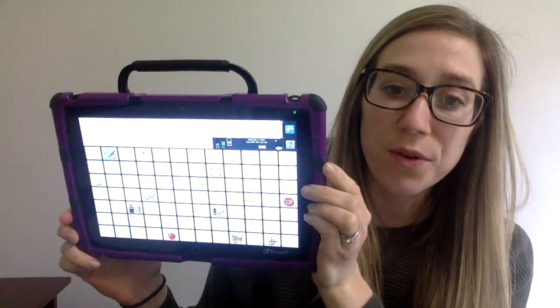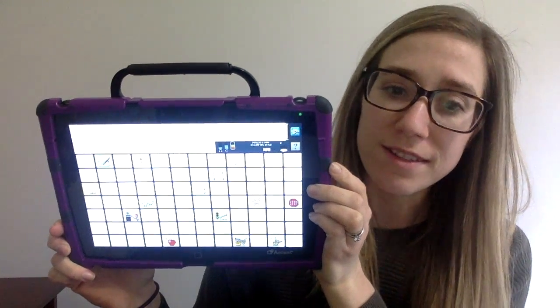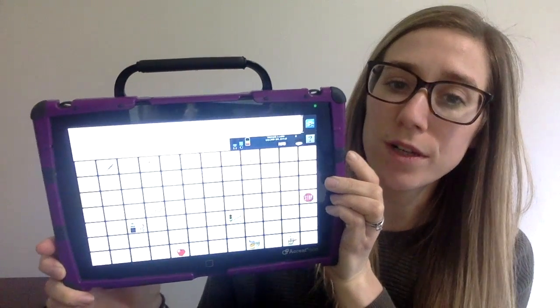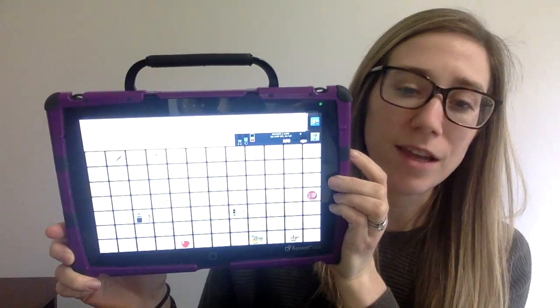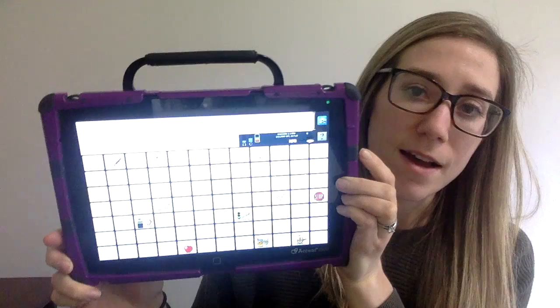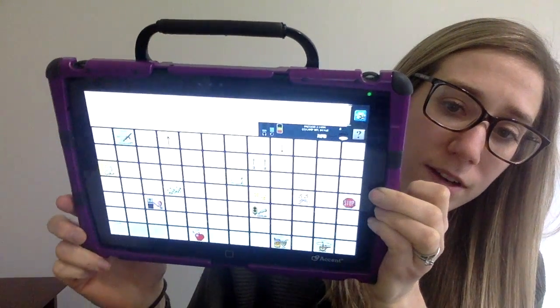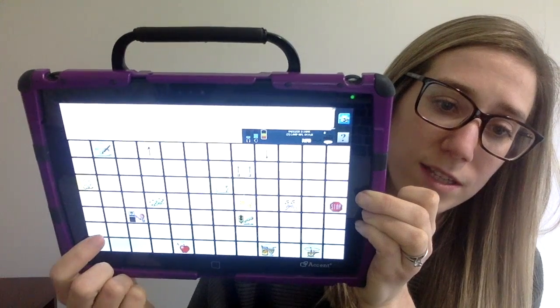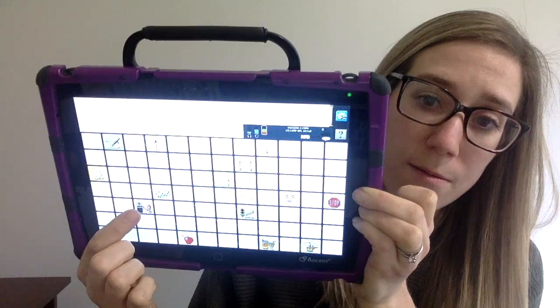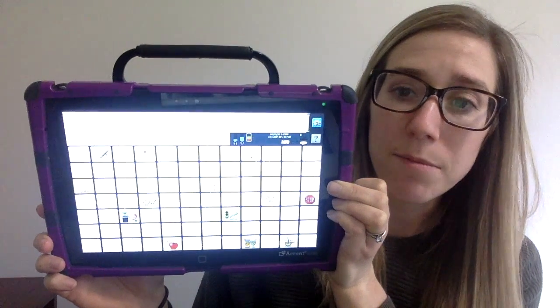In this video, we're going to go over the Vocab Builder feature on the accent. Vocab Builder is nice for when you want to practice just certain words or if you want to make the page just a little less busy visually. You can see on this page that only some of the vocabulary is showing. I have a lot of white spaces and only a few of my words are showing up. So this video is going to go over how we make that happen.